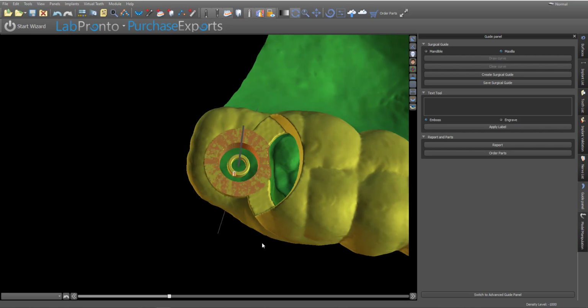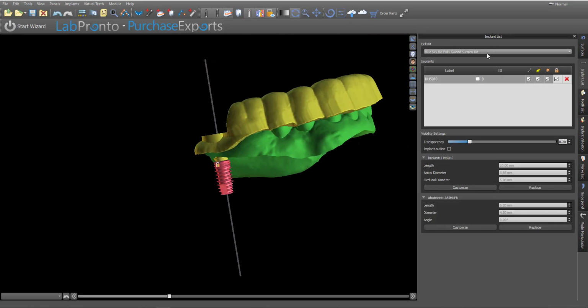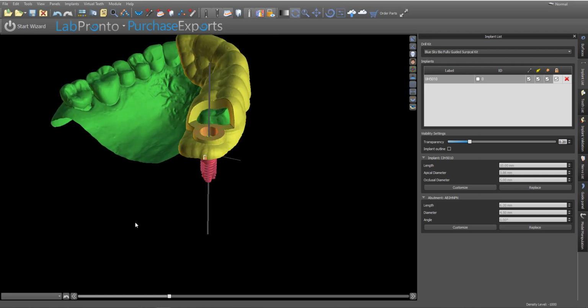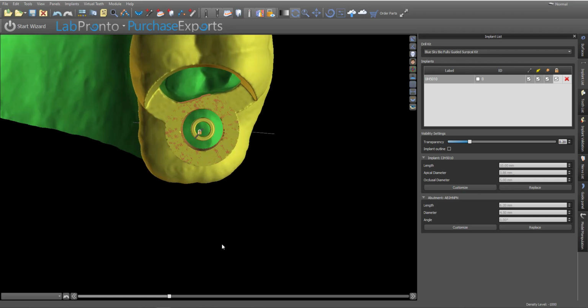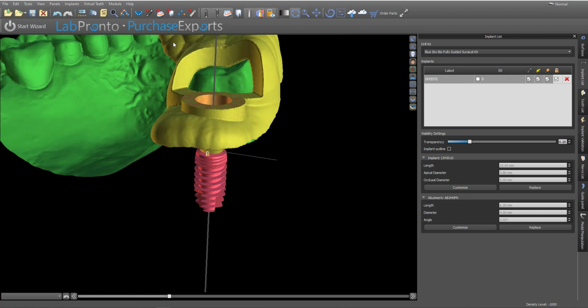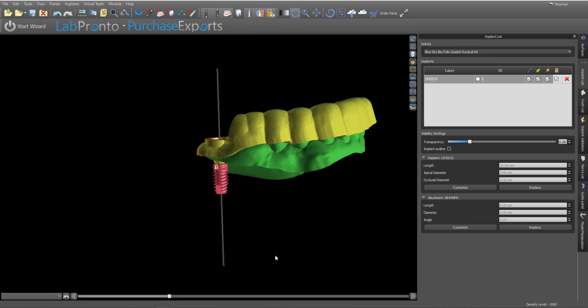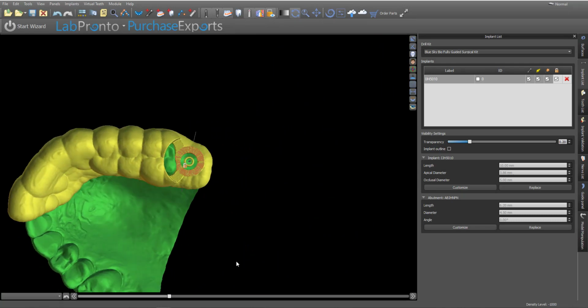Okay, here's our surgical guide. So if we use this, and if we use that Blue Sky fully guided kit that we've chosen here, then we can say with near absolute confidence that that implant is going to be extremely close to this position. Okay, there should be no major deviations here if you've done everything fully guided. So we know the implant is going to end up there.